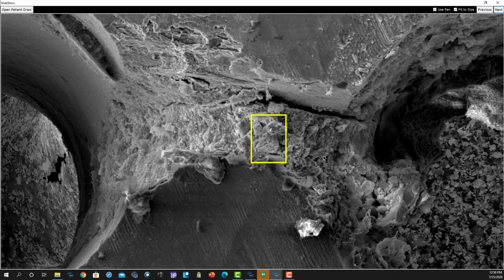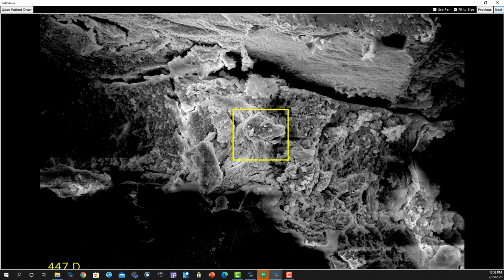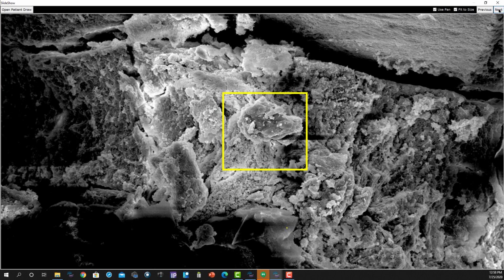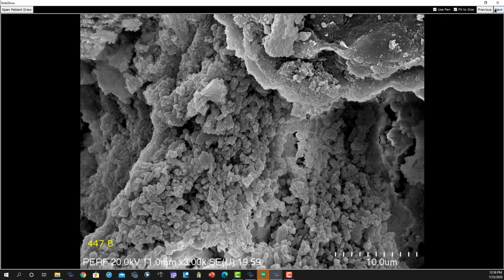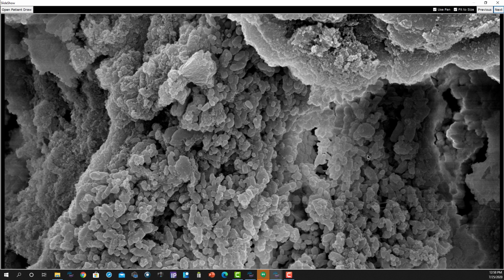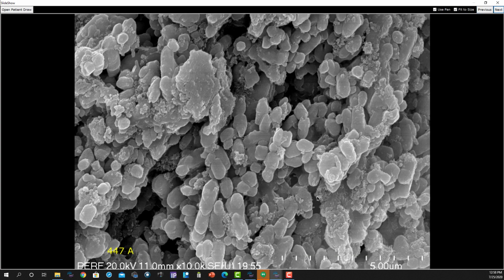And when you actually go in and look carefully at this material in the isthmus area, I'll try to take you through sequentially so you don't get lost in the magnifications. We're still in the isthmus area here. We're going to look into the area and see what we see. And what you see is a massive biofilm in that tissue in the isthmus area.